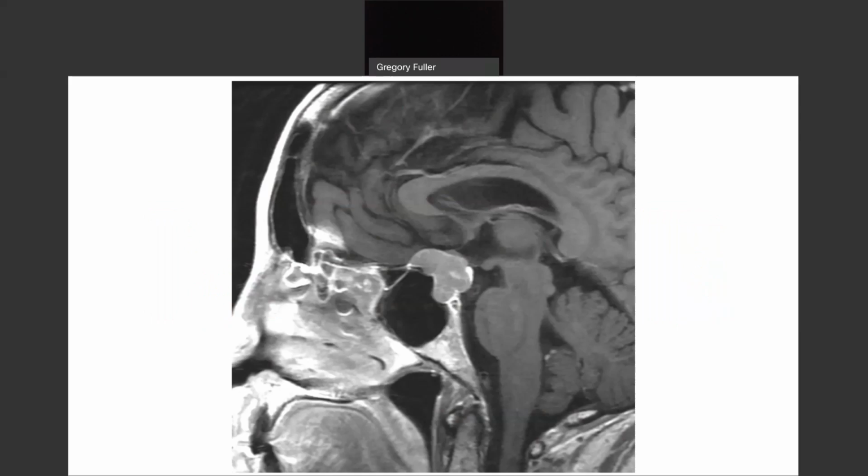All right, Dr. Harb came close. I will show you why. Dr. Harb, there's something better, and this comes with experience. It comes with knowledge. Do we have any neuroradiologists? Yes, Michael Evans. Absolutely, Michael Evans nailed it. I'm not going to give it just yet because I have a little bit more to say. Michael Evans is a radiologist. He's a graduating fellow. He is an excellent neuroradiologist, and he nailed it.